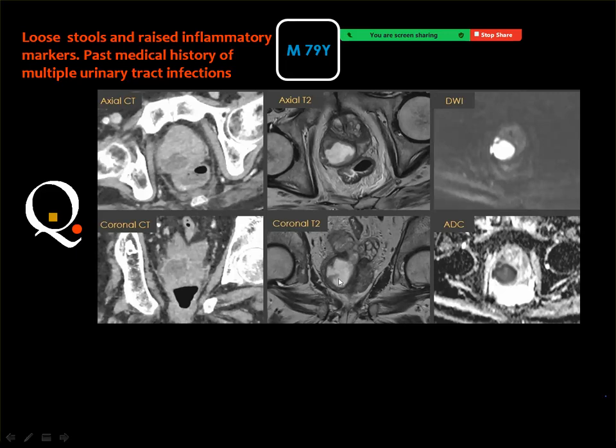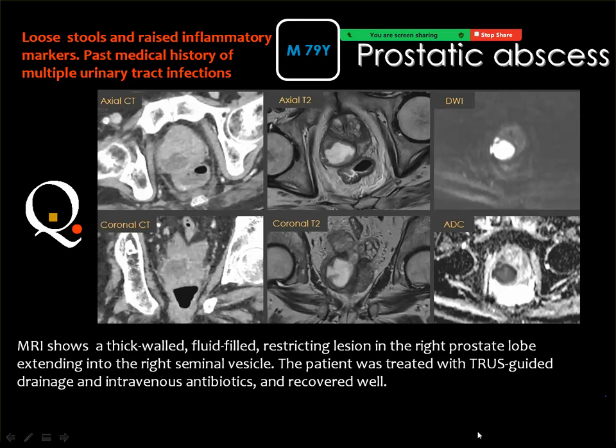Okay, and this is a straightforward case of a prostatic abscess. If you look here and you see a collection that is marginally enhancing in the axial and the coronal images, and the abscess is bright in the T2 weighted images and the contents will show marked diffusion restriction. This is not a prostatic cancer because the prostatic cancer is black or of low signal in the T2 weighted images. And the prostatic cancer does not look like fluid in the CT images. The answer is a prostatic abscess.